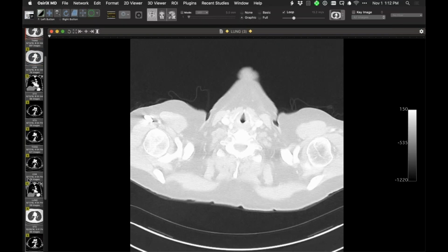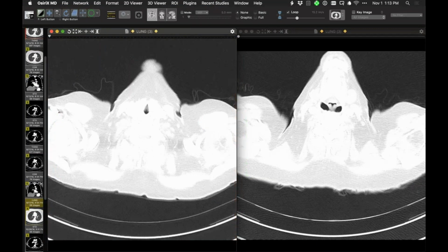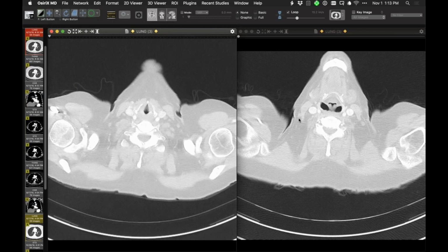And the size of the patient. I had people with Hounsfield units of 300 who are morbidly obese, and they're scanned at 100 kV, and the noise standard deviation is 90, and you can't see anything beyond the central PAs, even though technically it's a quote unquote good bolus. But it's followed by some people here, and I yell and scream at them all the time. If I'm reading it, just remove the ROI so I never see it, please. But yeah.